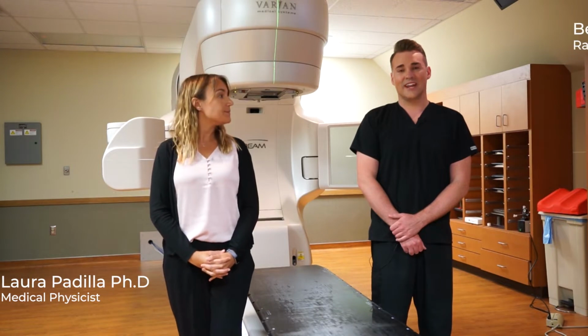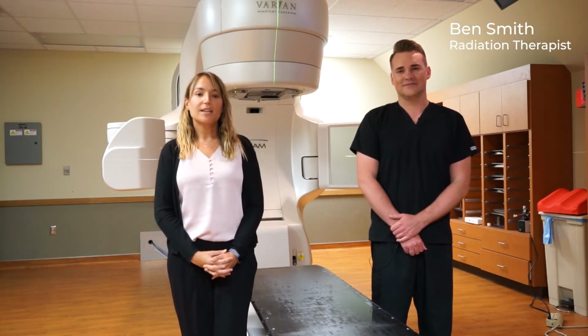I am Dr. Laura Padilla, and I'm a medical physicist. And I'm Benjamin Smith, a radiation therapist. Today, we will give you an overview of the treatment room, the linear accelerator, and some of its components.